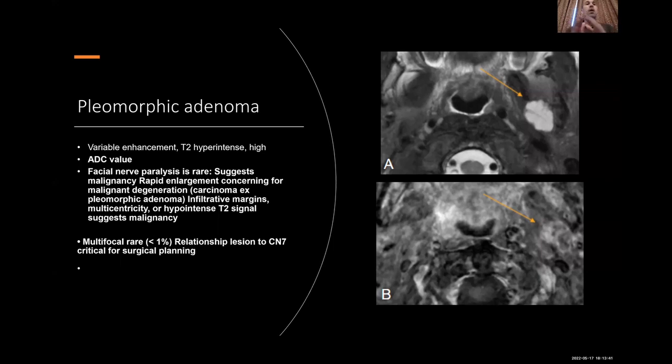The ADC value is high, so it is not pathological; the pathological finding is a low ADC value. The problem is compression. On the other hand, the ENT or head and neck consultants generally don't wait until something wrong develops in the head and neck. Most of them will take it out.